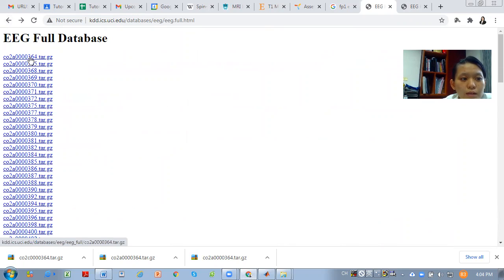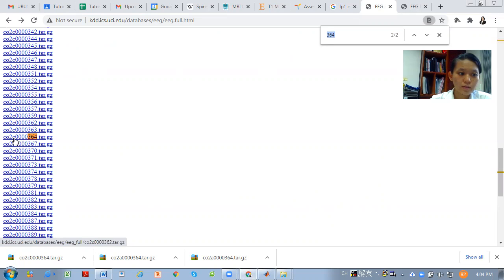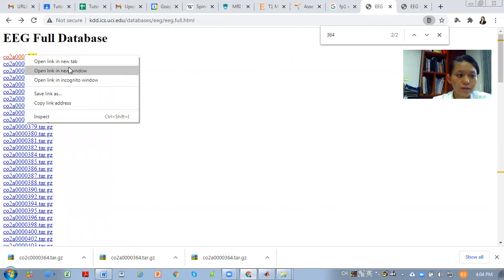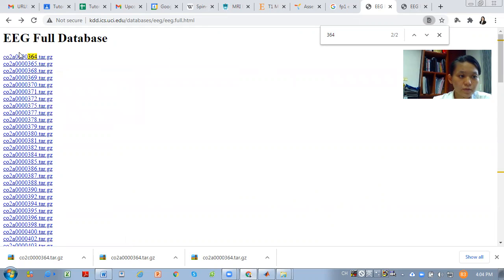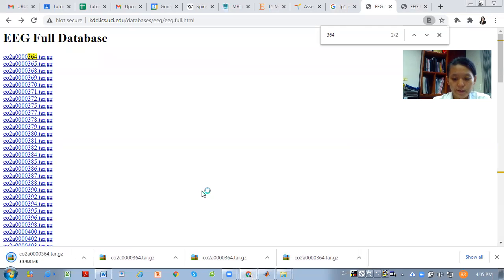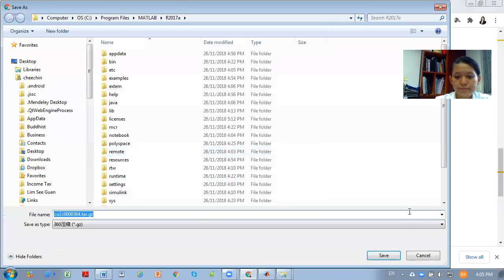So we take one subject, subject number 364. This one is A, which means alcoholic. So we have 364, the first one, and this one is C, the control, for 364. Then we right click and click save. Now we save it in our file. Save. And then we save for our control. Save. Okay, save.